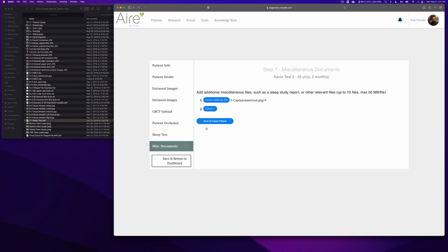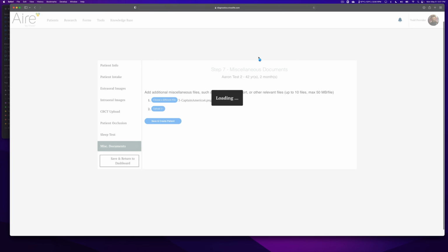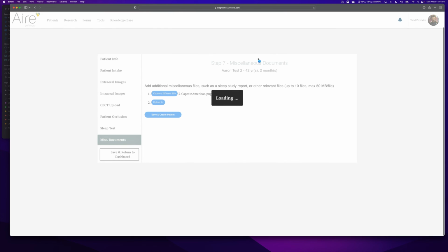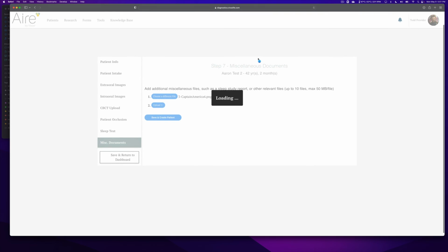Once we've done all that, and all of my exclamation points are done, we'll go ahead and save and create the patient. Now it's going to ask, you've gotten all this information in, we're ready for an airway intelligence report. Let's make some selections regarding that airway intelligence report here. We'll give it a minute. I'm on a testing site here, so this may take just a minute.